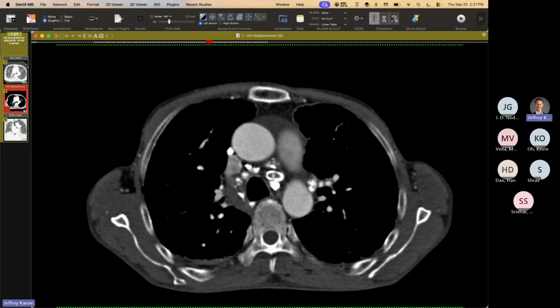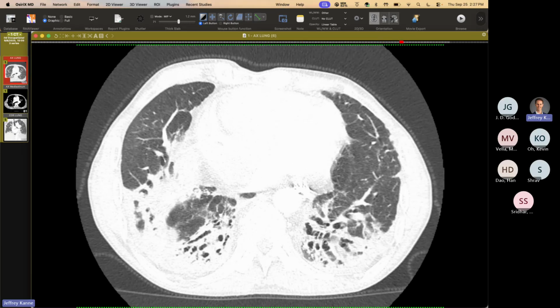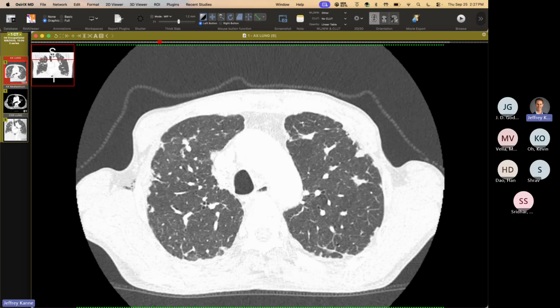And I was trying to decide if I could blame this all on silica exposure. There's some mixed literature about fibrosis, but I suspect this is not. This is probably connective tissue disease and not silicosis. I mean, people have talked about a fine fibrosis in the bases, but I don't buy it for this. The PPFE is a different story.